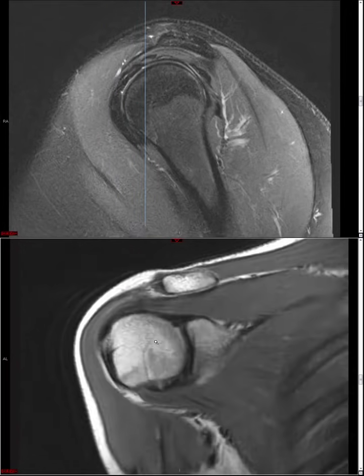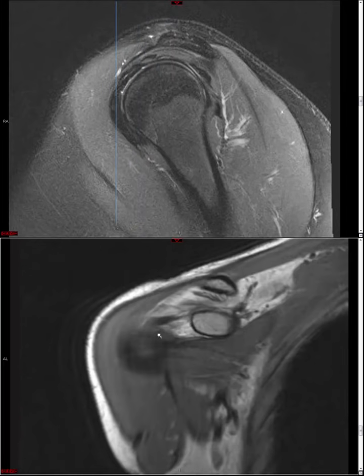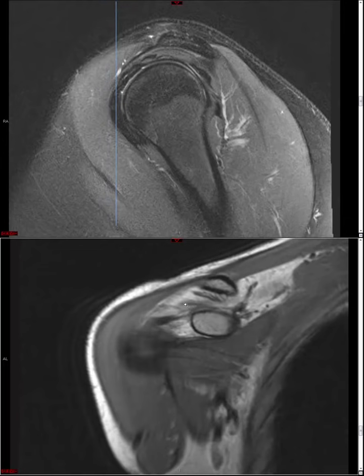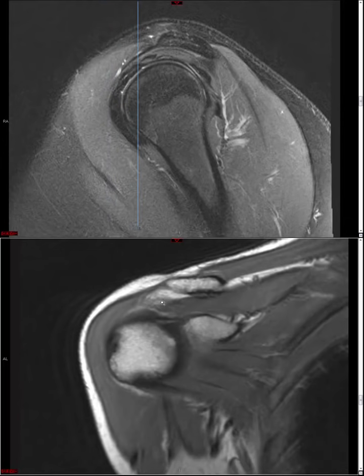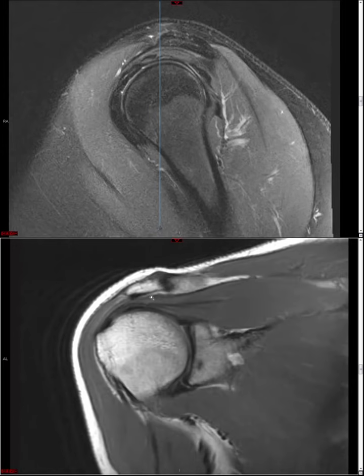Shockingly, you can actually find this quite nicely on the coronals as well. So let's just go through that. So here's a coracoid, and let's see, I would say maybe that's a coracoacromial ligament, follow it across, and then you're going to see, okay, there's just the anterior leading edge of the acromion, and on the coronal generally it will appear as a sessile, broad-based bony excrescence, right at the coracoacromial ligament attachment. Okay.